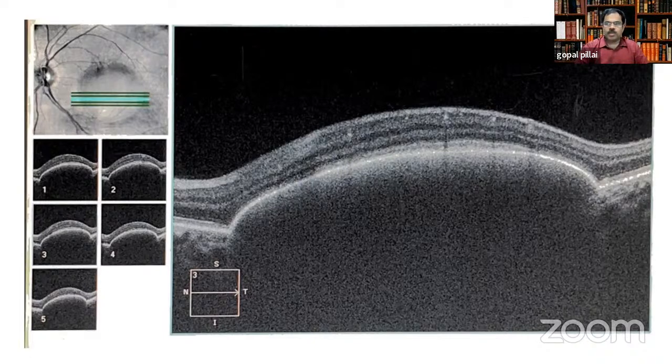Actually, we need to look at whether this is a treatment naive patient or a patient who has been treated multiple times and the pigment epithelial detachment has had multiple injections, and there will be a little rough, tough retinal pigment epithelium. That surface becomes thicker. So I think this may have been repeat injections. Basically, this lesion is pretty large on the infrared image that you are seeing here, and the flattening has probably reduced with the treatment. This is what I think from this picture, but as Natasha said initially in our talk, you should correlate clinically.